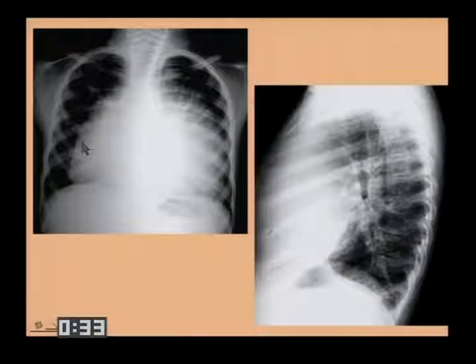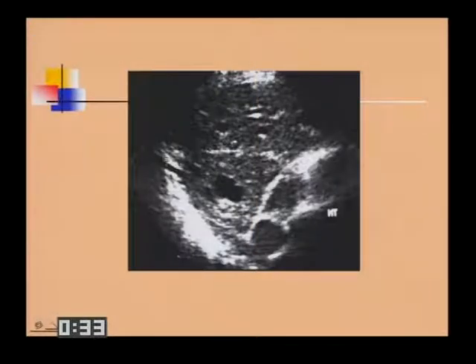The children get lymphoepithelial cysts, and this is an ultrasound. Since the gland was so big, you could come right up against under the ribs and under the sternum and image it, and it was filled with a lot of these little cysts, the same way that children will have lymphoepithelial cysts in their enlarged parotid glands. The thymus also participates in this process.